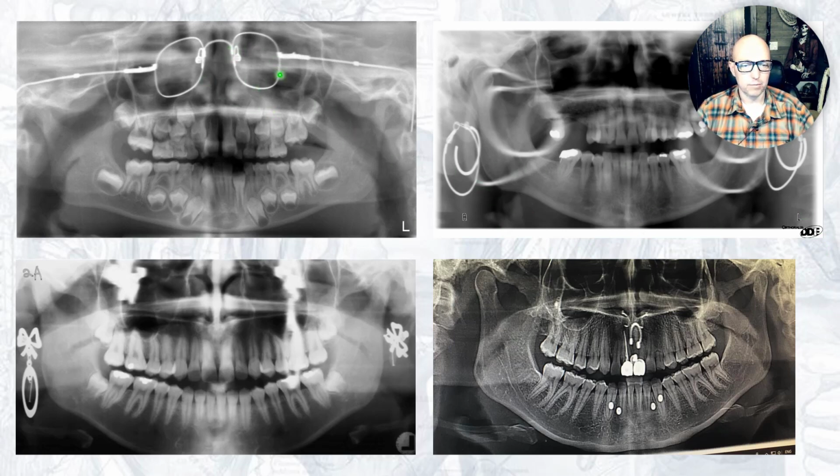So, glasses, metallic glasses, earrings. These ghost images are really interesting. One interesting thing about ghost images is it looks like it's not flipped. It's not a mirror image. Shouldn't it be a mirror image? Because it gets flipped, but it actually gets flipped twice. Once because it's on the other side, and once because it's crossing through the point of rotation the other way. And so you don't see a mirror image, but you see a real representation of that earring.